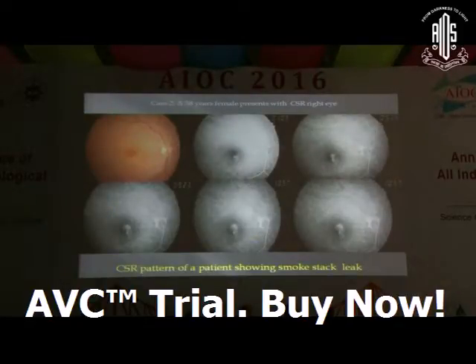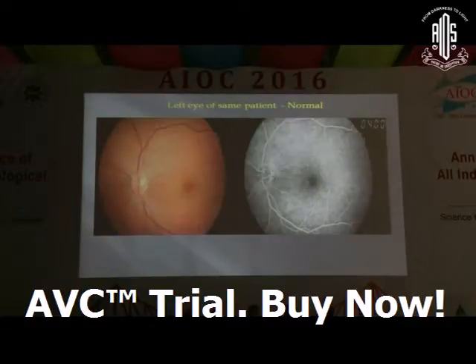Case 2 is a 38-year-old female presented with CSR. The CSR pattern is that of a typical smokestack leak. The dye is ascending from the point of leak and making almost a mushroom shape. The left eye of the patient is again normal.